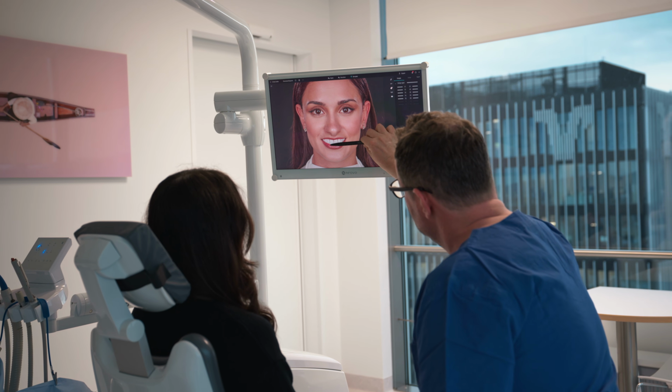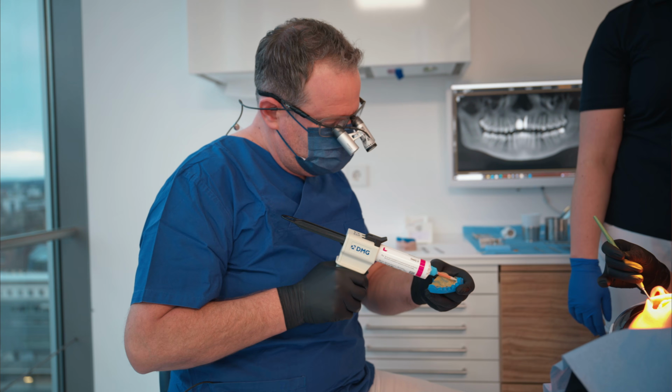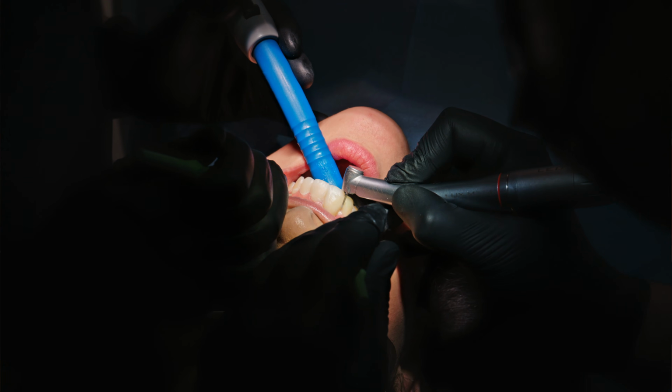Now you have laid all the groundwork for presenting and discussing your treatment plan with your patient, where you will explain every single detail of the treatment you are planning to perform for your patient. Talking about the design of the future tooth shape and the ceramic restorations, you may either present an AI-powered 2D digital simulation, or you may perform a mock-up in the patient's mouth in 3D or even 4D. All these simulations are obviously based on your design and treatment planning efforts.